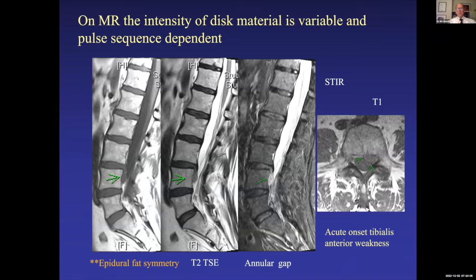If you see it, it should be equally thick at the top and bottom of the vertebra. Notice at the L4 level where there's grayness coming down from the L3-4 level, that's an extruded and inferiorly migrated disc. The fat is preserved inferiorly, but you don't see it up on top. So if you see the fat isn't equally distributed top and bottom, something's wrong, and take a closer look.